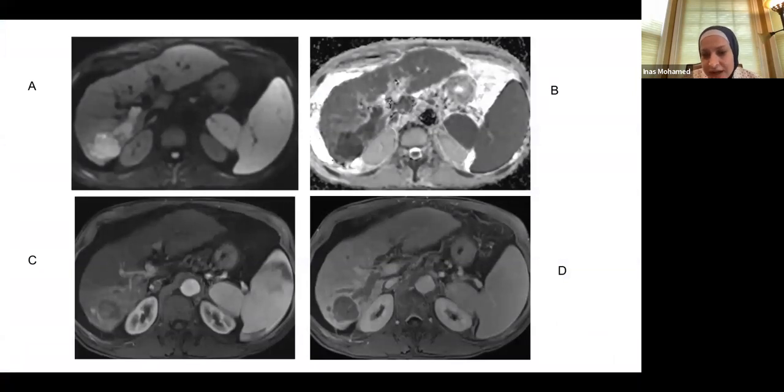This is the same patient, and I just want you to look at this structure in there. This was multifocal HCC actually. This is a diffusion weighted image here. So this is a high B value DWI. Usually we can go up to a B value of 600 or 800 in MRIs of the liver. This is the ADC map. This is the arterial. Actually, that thing was necrotic, and this is a washout. What is that?